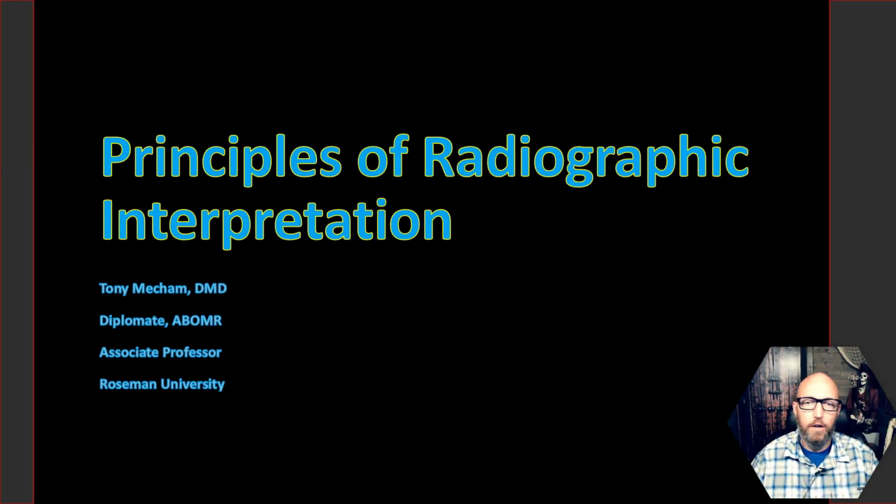So this is a lecture on the principles of radiologic interpretation. This is probably the most important lecture as far as my courses and getting you started into interpreting and diagnosing from radiographic images. So pay a lot of attention to this. Some of it may not make a lot of sense until you've seen some of the other lectures, so I would recommend going back to this after going through the rest of my lectures and really reviewing some of the cases in here, as it highlights really important processes in your thought process and coming to a radiographic diagnosis.